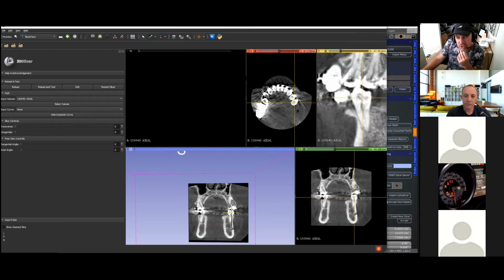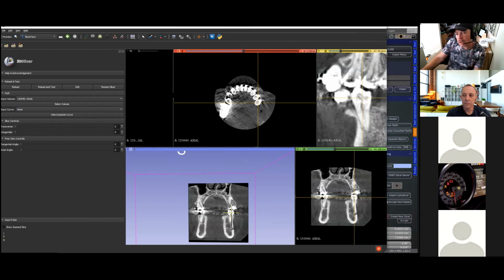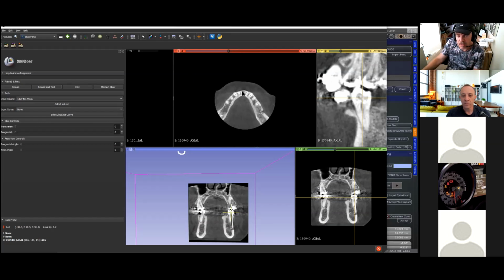We're going to be drawing, because we've got an upper and a lower, we need to have 2 curves. You want the slices to move according to the upper curve and the lower curve. So how do we do this? The first thing, let's do the lower one first. I mean, the order is up to you how you're going to do it. So I'm going to choose my slice and my lower model, and then we can go straight to making curves, or we can choose.